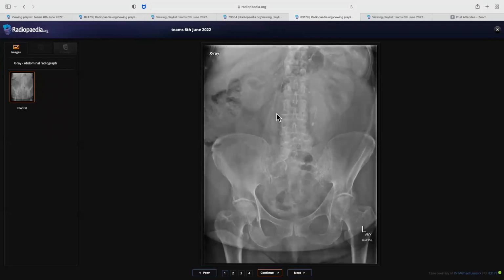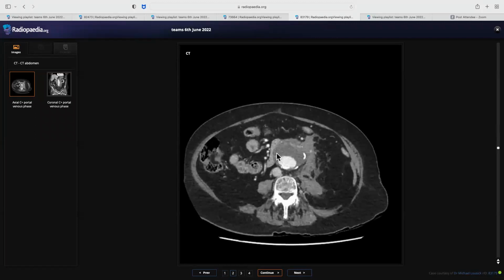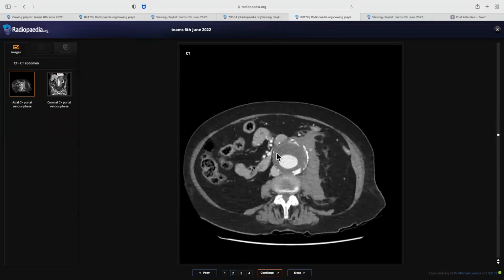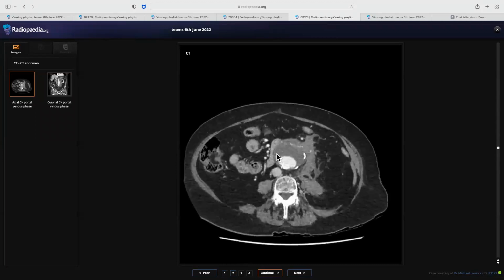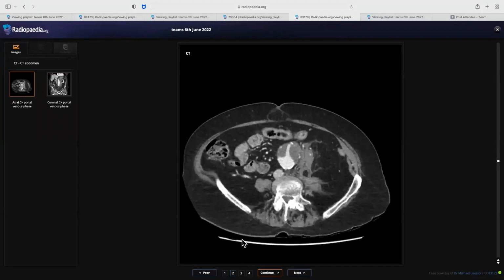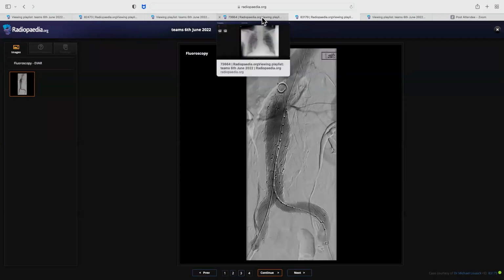And there was calcification outlining the aorta, which was indicative of abdominal aortic aneurysm because it was appearing widened. And this is the ruptured abdominal aortic aneurysm, which you can see, and that's the hematoma. So basically, this patient was managed interventionally after that, and they did stenting and sealed the leak. So the patient was managed, as you said, with referral to the interventional team.